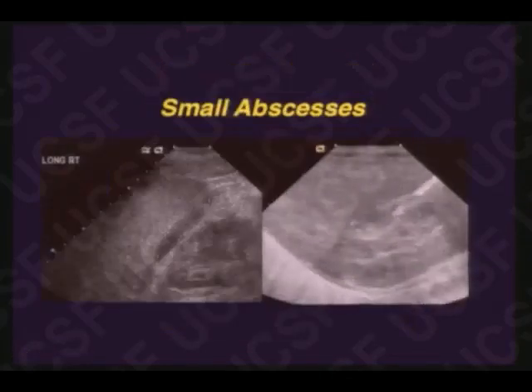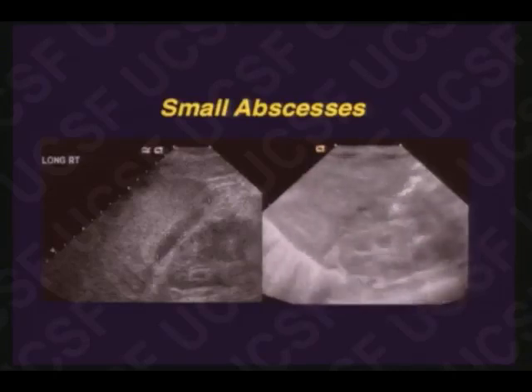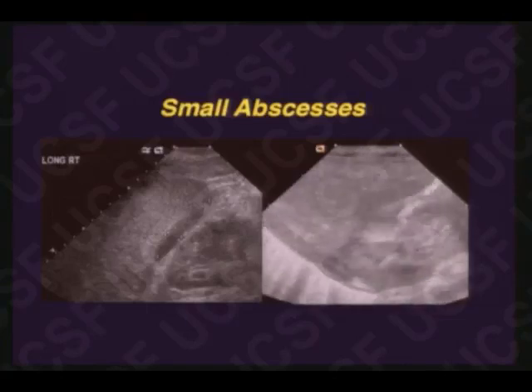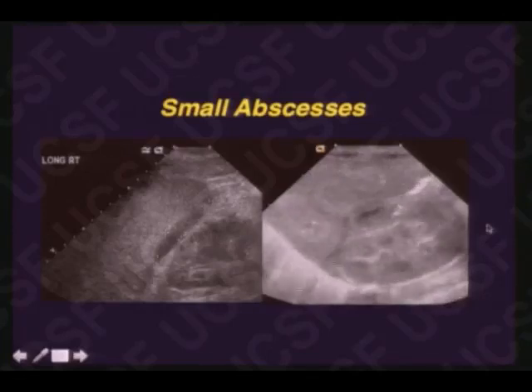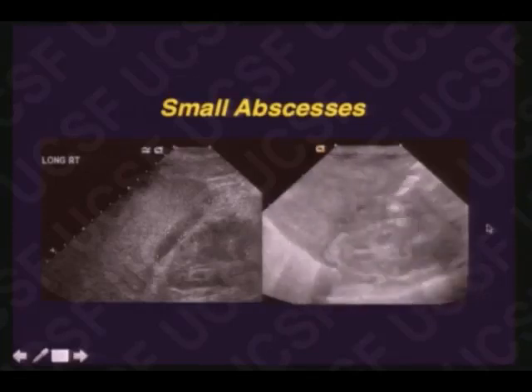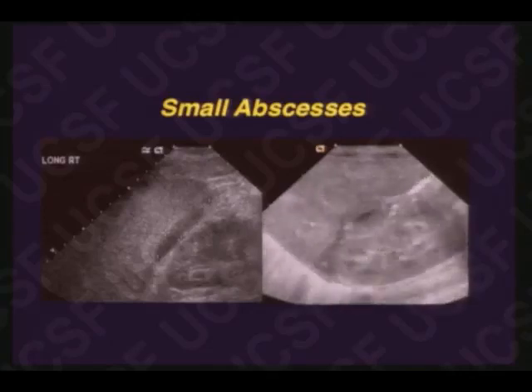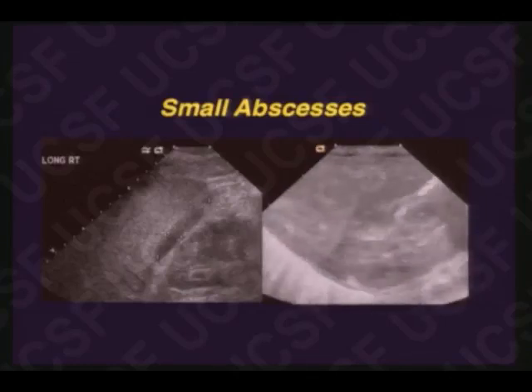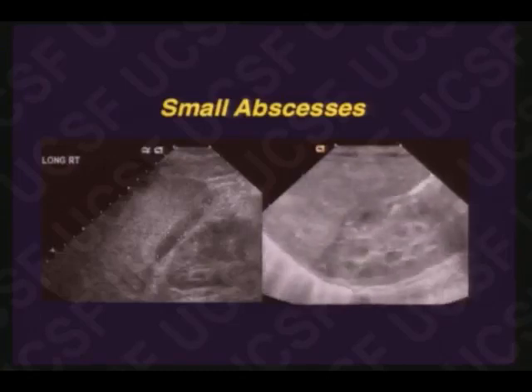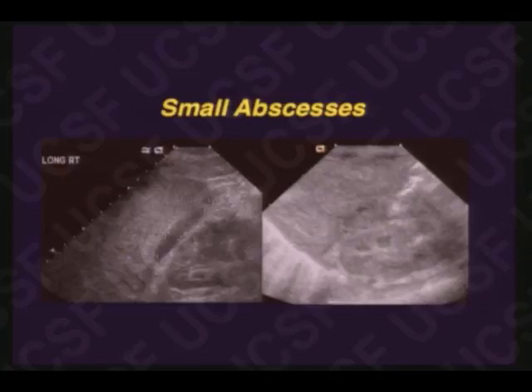So, it's not an issue of big abscess and small abscess in terms of detection. It's a matter of interrogating the space. These small abscesses would not be drained by an interventional radiologist. They're too small to go after. So if our contest is that we're only going to look for abscesses that actually end up getting drained, you're going to have a really hard time beating me. You'll probably beat me, but you'll sweat it out before you do.